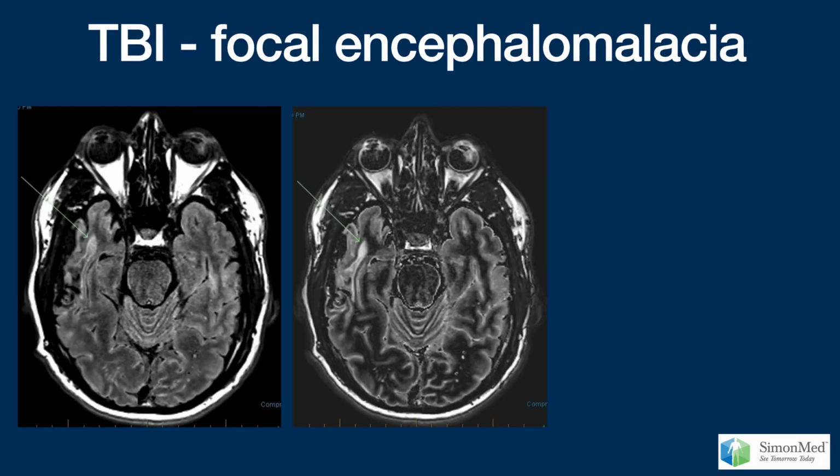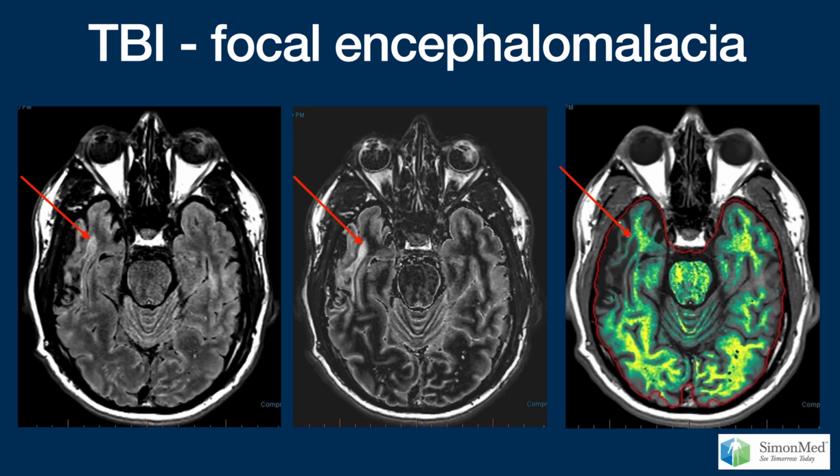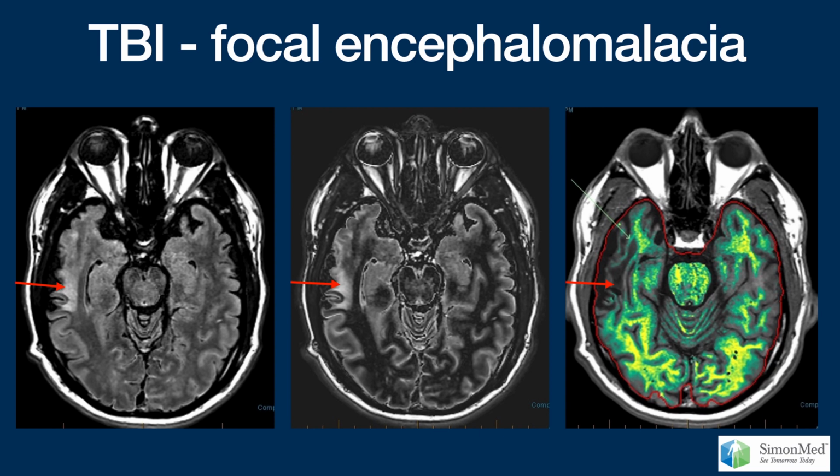The next clinical setting is traumatic brain injury. Just two examples will suffice to illustrate focal and global changes. Here is an example of post-traumatic temporal lobe focal atrophy on FLAIR and DIR. But what about the T2 FLAIR hyperintense rim? In this instance, the rim has no myelin. One slice higher, the myelin loss is also matching the encephalomalacia on FLAIR and DIR posteriorly. But anteriorly, FLAIR and DIR look normal, while there is additional myelin loss that would otherwise be undetected.